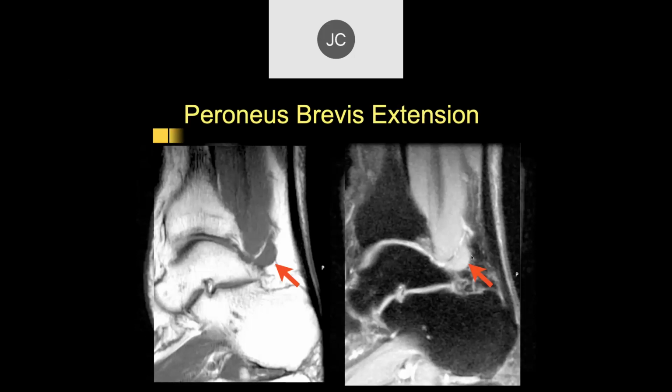And we've talked in the past about congenital syndromes where the muscle extends too distally and actually goes into tight spaces which are designed just for the tendon, and it could produce impingement. We talked about that with the supraspinatus muscle and tendon of the shoulder. And this is just an example of a muscle here. When you flex and extend, the muscle can be impinged by the bone, the canal and the peroneal retinaculum, and can produce injuries and pain syndromes of the distal muscle.